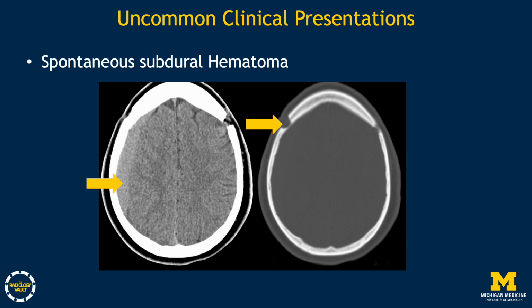In this 52-year-old male presenting with headache due to right-sided spontaneous subacute subdural hematoma, we also notice evidence for prior bilateral burr holes for evacuation of spontaneous bilateral subdural hematomas in the past. SIH was suspected as the underlying etiology, and further workup documented a CSF venous fistula.